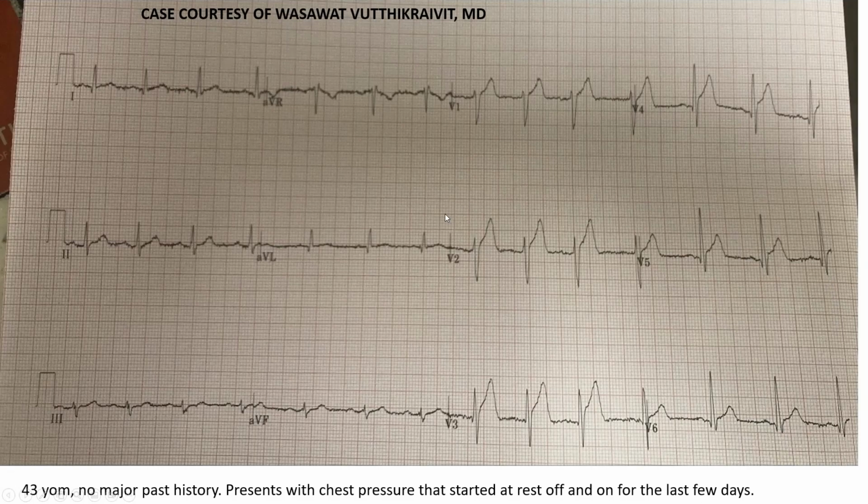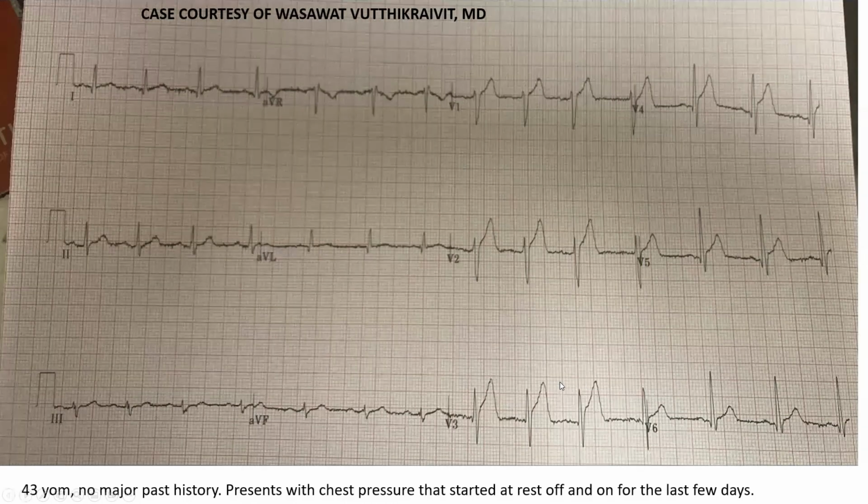What's the diagnosis on that EKG? Could this be pericarditis? This is not pericarditis. This is a STEMI. So we see ST elevation in the anterolateral leads, predominantly in V2 through V5. When you see that, go through the differential: STEMI, pericarditis, early repolarization, or secondary to LVH or left bundle. The latter is not there. There is no LVH or left bundle. Could it be pericarditis? I don't think so. This is, in my opinion, definitely an anterolateral STEMI.